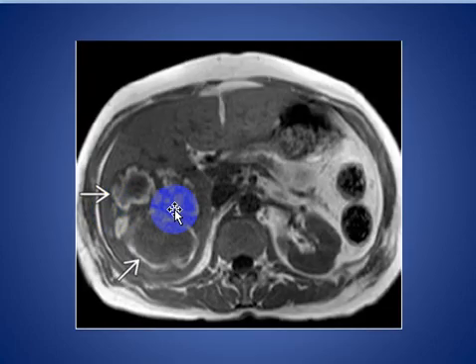And hepatic abscess, non-enhanced T1 weighted images shows encapsulated multiloculated abscess with heterogeneous fluid content with hyperintense on T2 weighted images, but not shown in this context here, and the component of hyperintense on T1 as we see here.